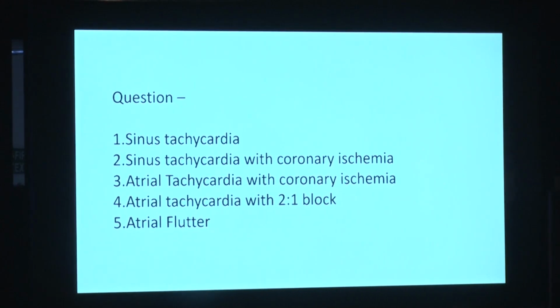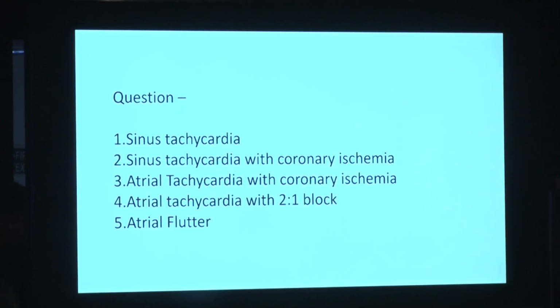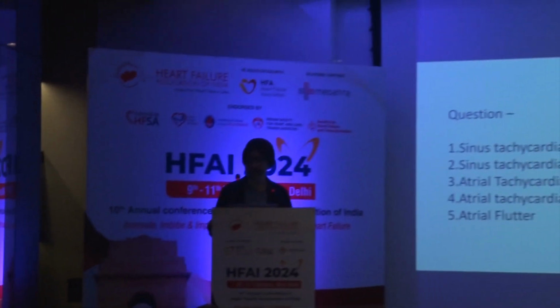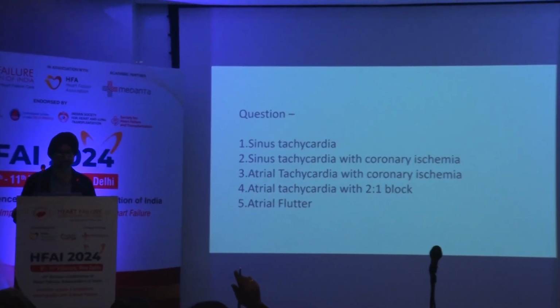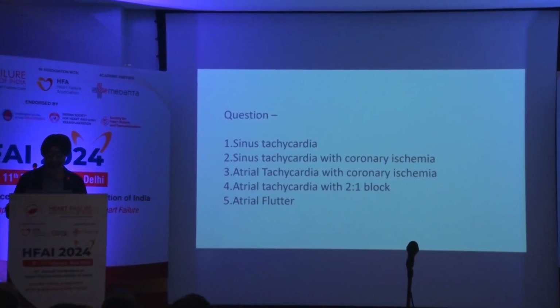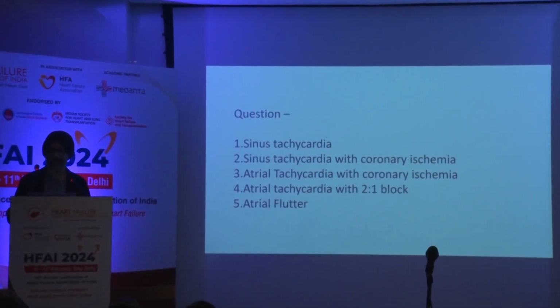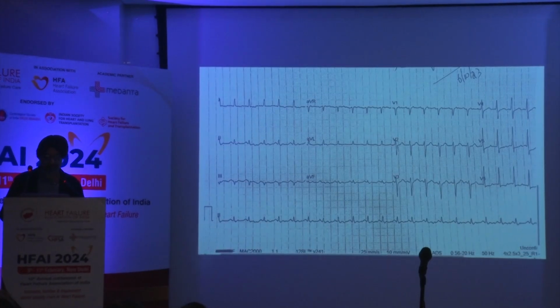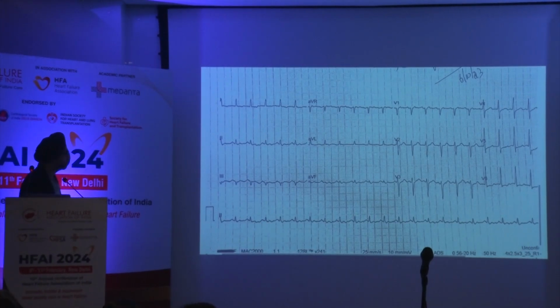How many of you think there is atrial tachycardia and there is ischemia? Both. None again. How many of you think it is atrial tachycardia with 2:1 block? So there are many. How many of you think this is atrial flutter? None. Okay.